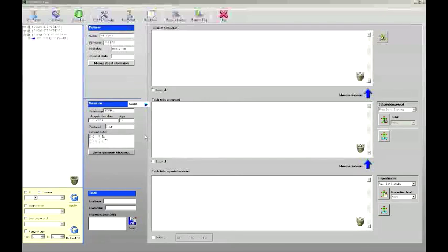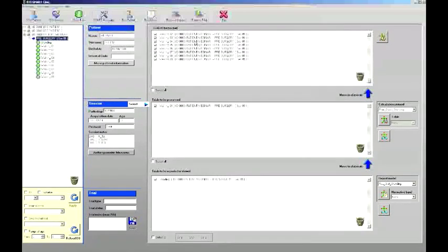We are ready now to start the processing phase. If you click on the session node, each trial will move into the corresponding field based on its own elaboration status. You know that after the acquisition, the trial needs to be tracked and then processed. You can see that the trial already tracked during the acquisition phase, for example, the walking number 1, is already in the field for the processing. All the other ones need still to be tracked.